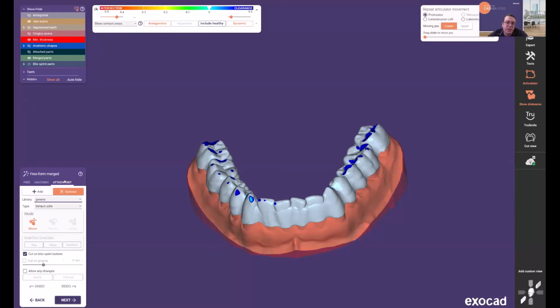So just because it shows the articulator in the wizard at that point, you can certainly click the next button, skip it, design the splint to ideal material thickness and shape, and then exactly what Dan said, run the articulator later.